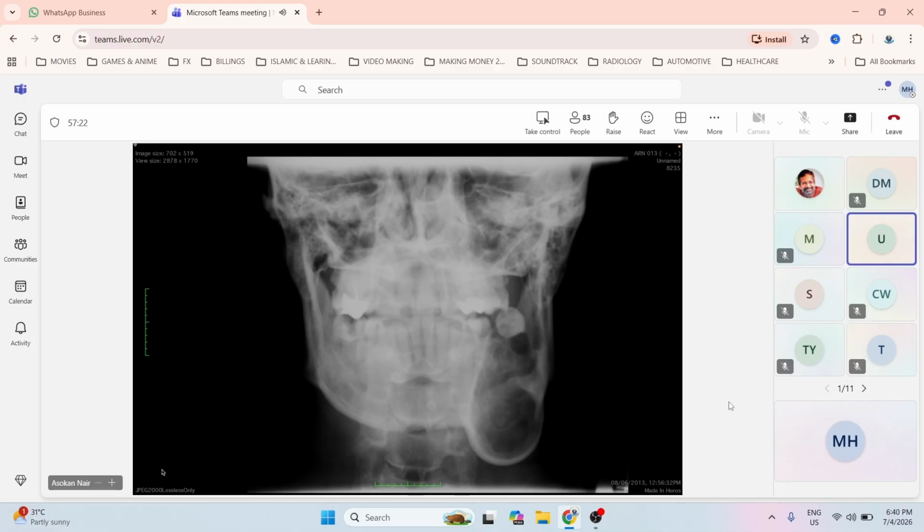So for the diagnosis, I'm giving a diagnosis of ameloblastoma. And the other differential diagnoses are odontogenic keratocyst and also aneurysmal bone cyst. Okay, fine. So what do you call this? Odontoma? No. Well, why is the tooth up there, not down here? What is it doing? Floating teeth.